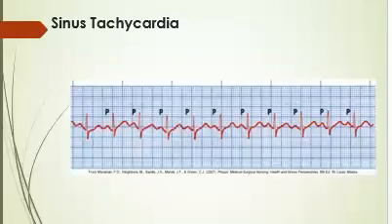So here we go. Here's an example of sinus tachycardia, and as you can see, the P waves are actually identified for you, but look how close they are to the T waves. All right, so do me a favor, guys. Take a minute, count them up, tell me what you came up with. You should have come up with 110. So 1, 2, 3, 4, 5, 6, 7, 8, 9, 10, 11. Yes, there are 11 on there. You're going to count every QRS on there because that is a 6-second strip as well.